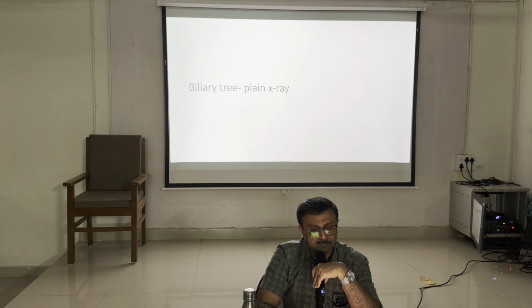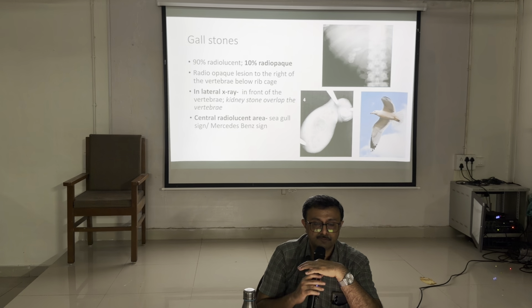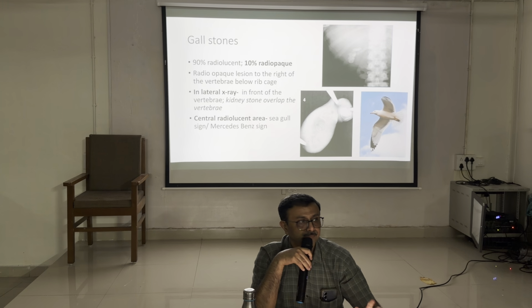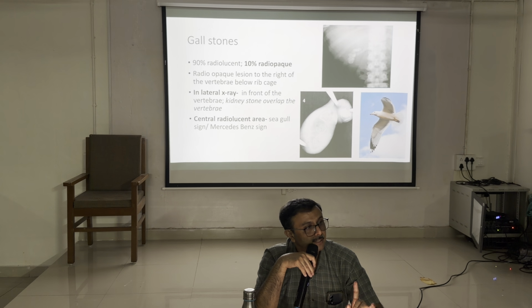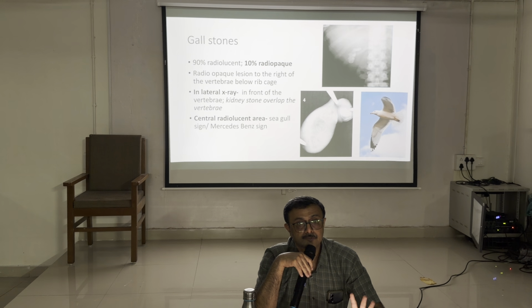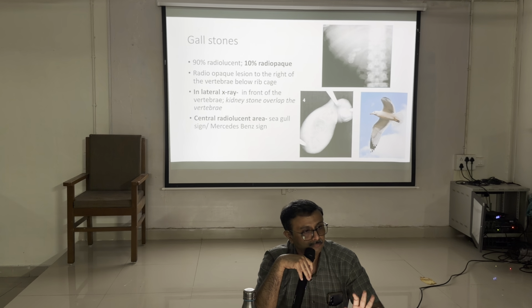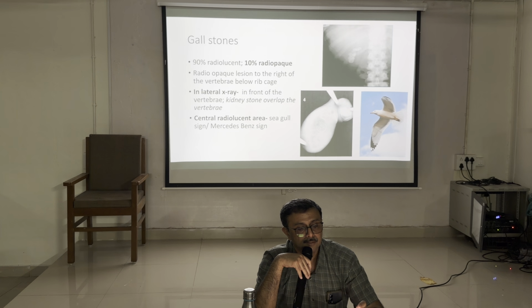Biliary tract plain X-ray, very few signs. Gallstones are sometimes visible on X-ray. Usually gallstones are radiolucent and do not visualize, but 10% are radio-opaque. So it is one of the differential diagnoses of radio-opacity in the right hypochondrial region. One of the differential diagnoses is radio-opaque gallstones.